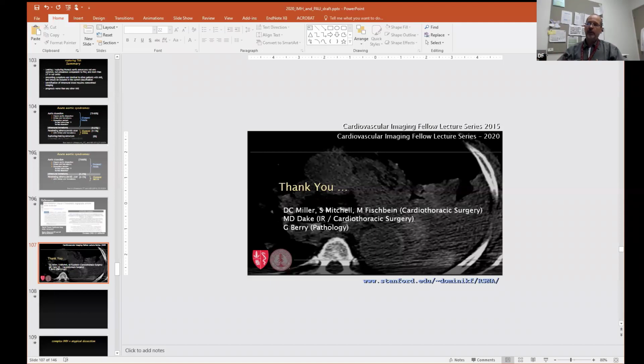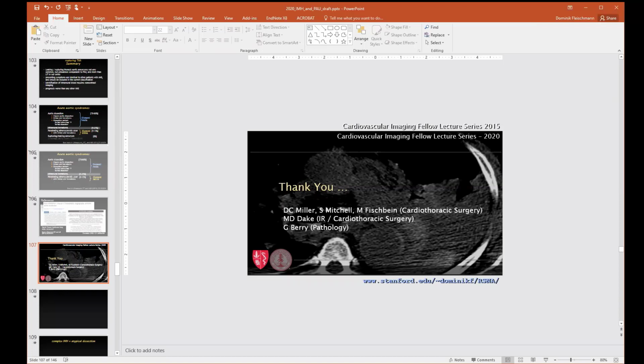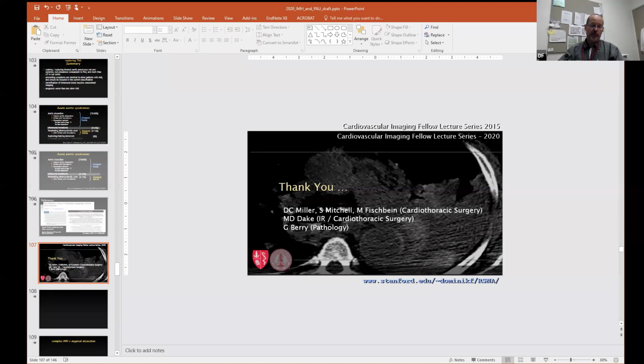But you're right, you could call this lesion a PAU with a small pseudoaneurysm, or a penetrating ulcer with a periaortic hematoma. I think as long as you make the diagnosis and say that this is a penetrating lesion and it goes beyond the aortic contour, and you can convey this, I think you've done your job. As you said, the main observation is it gets through the wall and probably needs to be addressed. A good point.